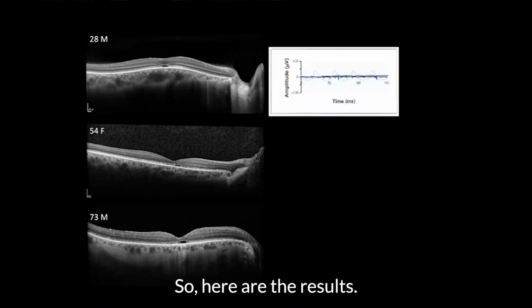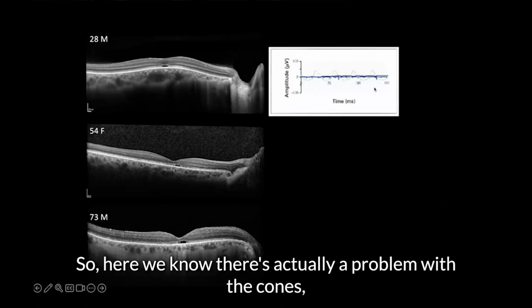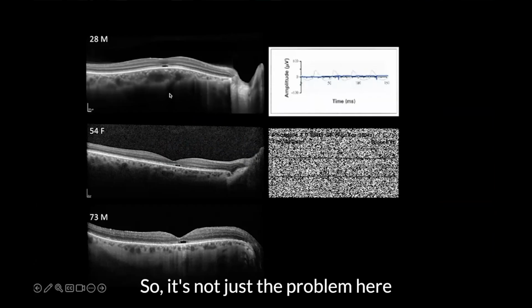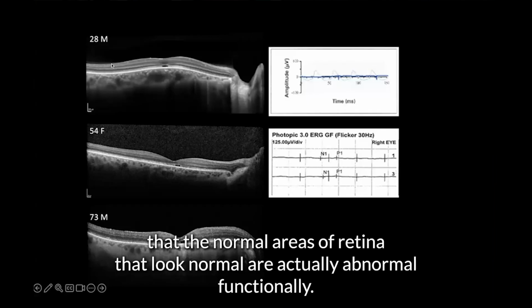So here are the results. First case, basically a flat 30 Hertz flicker. So here we know there's actually a problem with the cones, even though the abnormality is localized in the fovea. So it's not just a problem here. The areas of retina that look normal are actually abnormal functionally.